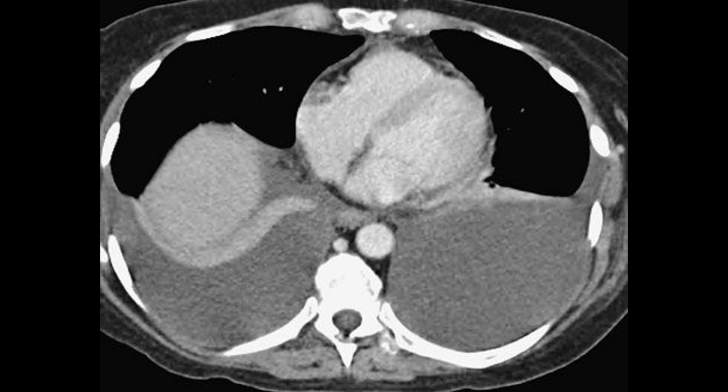When pleural fluid collects between the diaphragm and the lower lobe, it is referred to as a subpulmonic effusion. This pattern can be difficult to recognize on an upright chest radiograph. Radiographic signs suggesting a subpulmonic effusion include an increased distance between the stomach bubble and the lower lung of more than 2 centimeters, and lateral displacement of the diaphragmatic peak.